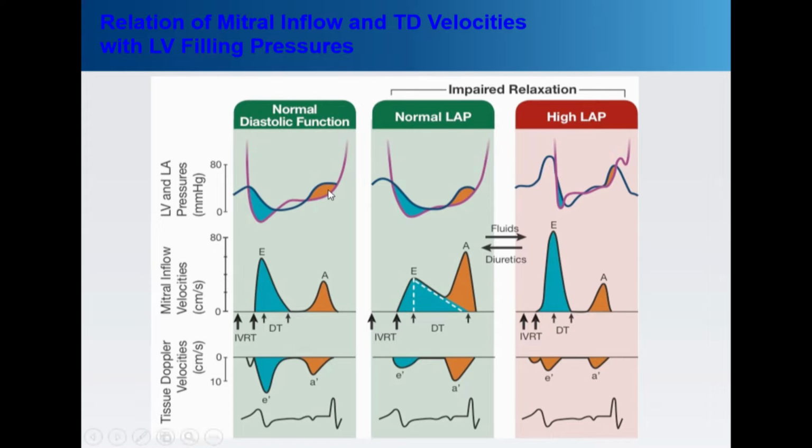With late diastole, the atrium contracts, and you're looking at the atrial contribution to LV filling. How fast the velocity rises, how fast the velocity decays, how quickly the mitral valve opens once the aortic valve is closed. These are all measurements that we look at, and they are the traditional measurements that were looked at in the late 80s and early 90s to gain insight into diastolic function.